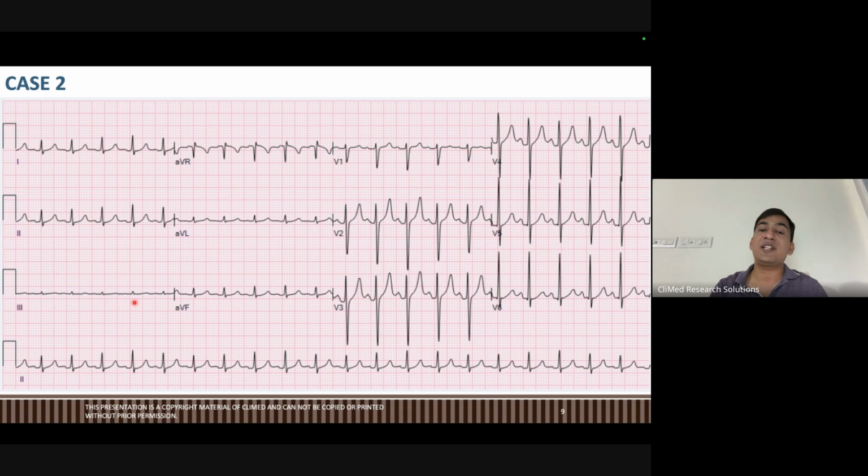If it is not visible in lead three, it's okay. You will say, sir, it is not visible. Consider it not visible in lead three. But if the P wave is absent, it should be absent from all leads, the entire ECG.